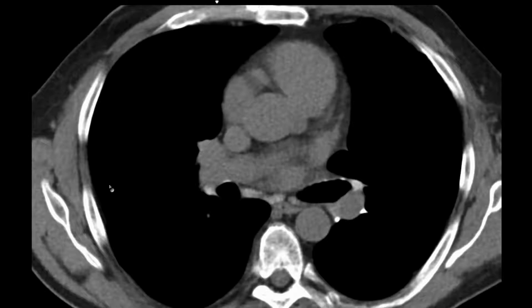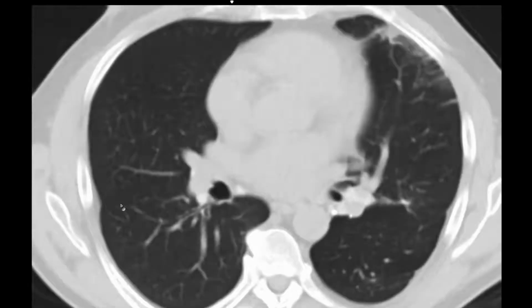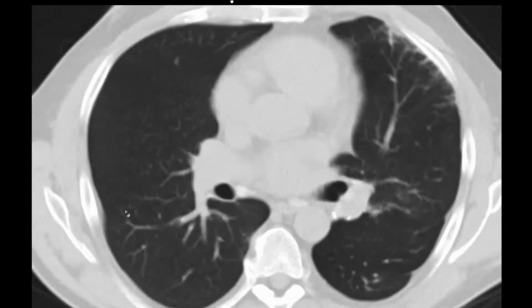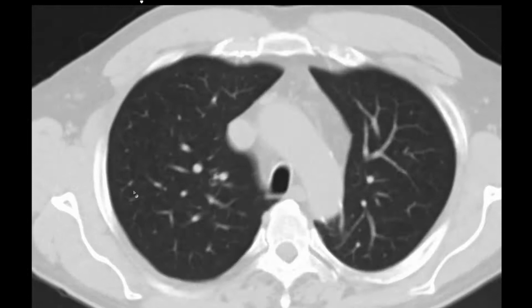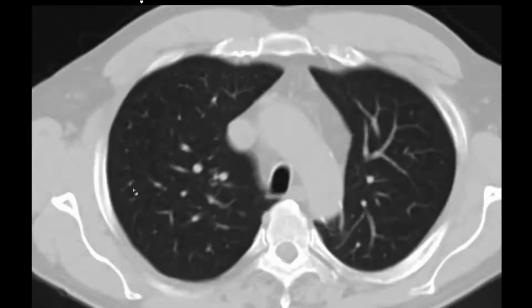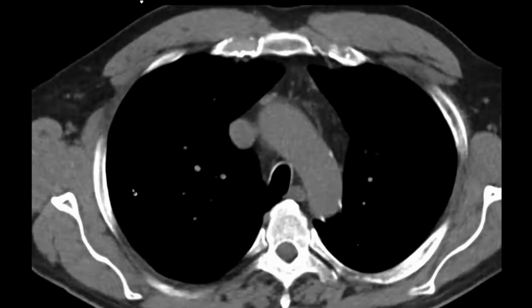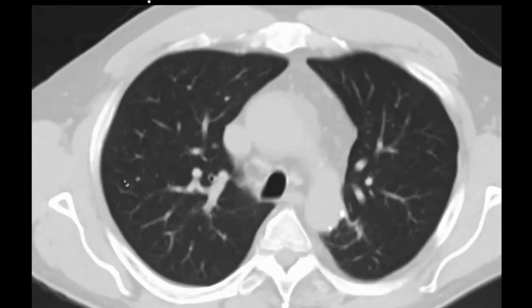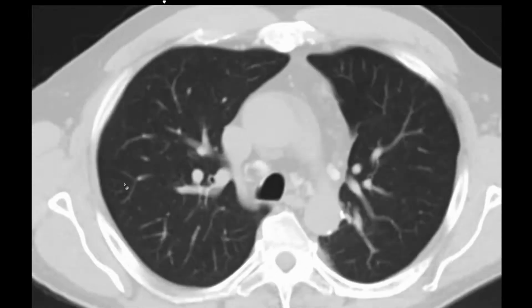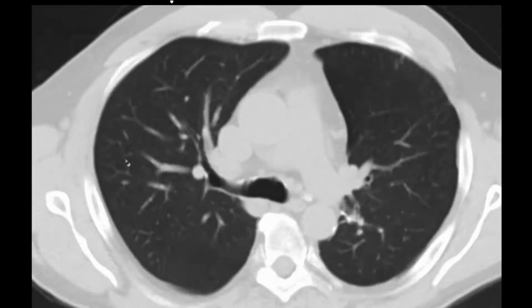Howard, is this still your case that's showing? Yeah, this is my case, yeah. Was there anything out in the peripheral, subpleural regions of the upper lobes? Because in the sort of co-worker's case that Jeff is describing, I've often seen these high attenuation collections immediately subpleural in upper lungs. And I think that's the lymphatics carrying the stuff out to the edges of the lung, depositing it out there. Have you seen that, Jeff? The subpleural sort of pseudoplaque distribution?